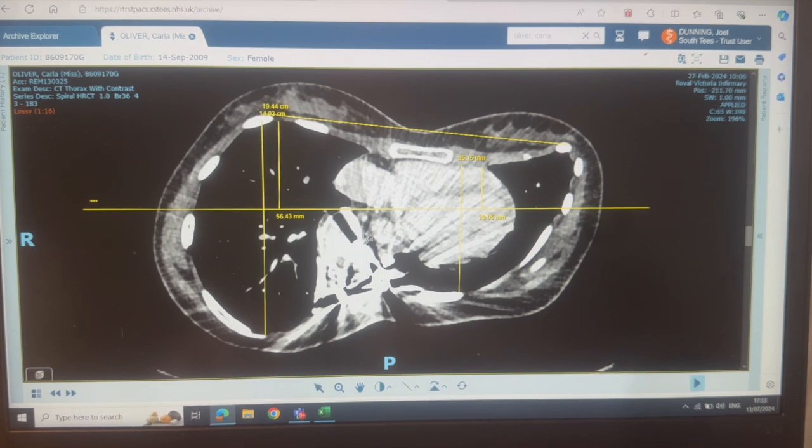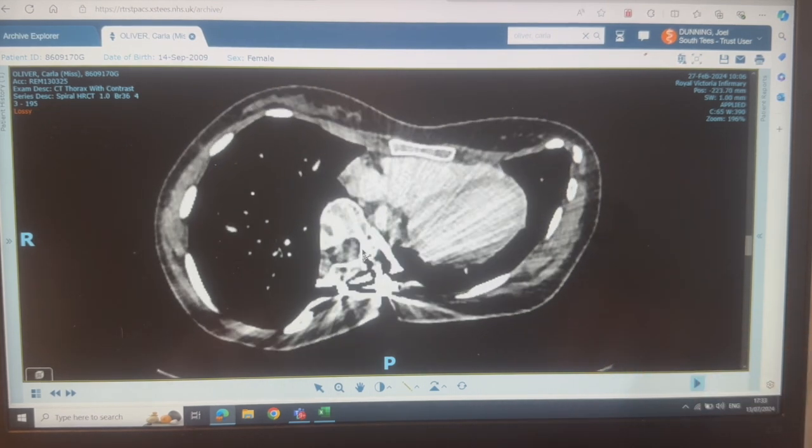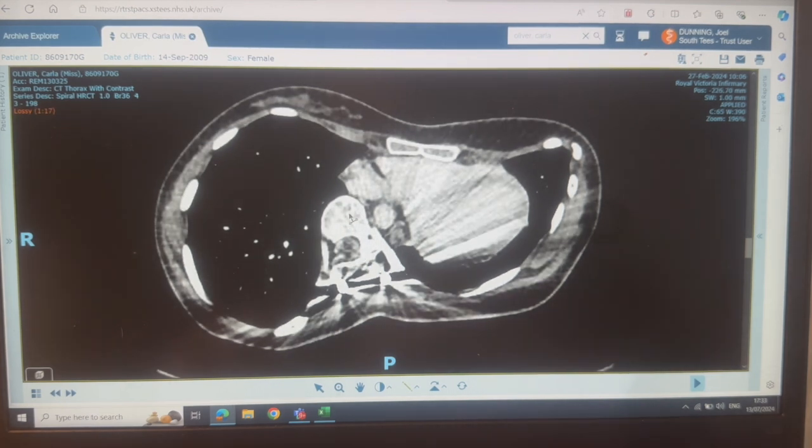For the vertebra, I actually scrolled down a bit. You don't have to do it from exactly the same level, and that vertebra was so wrecked that I went down to where I could actually see it away from the metalwork, because I was just never going to see anything. So I did the AP and the lateral for the vertebral index and the depression index on a lower level.